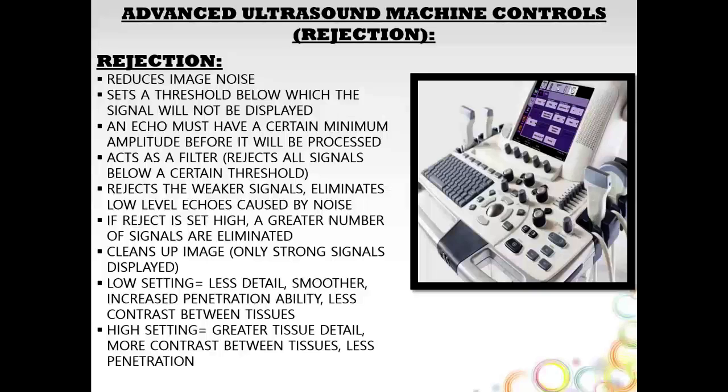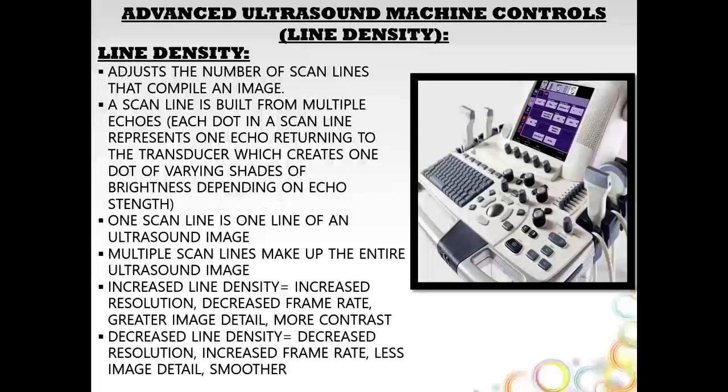So with the other controls, use everything in moderation. It's not really good on an ultrasound machine, unless you're trying to see something specific, to have any of these controls be too high or too low. We usually want something in the middle.